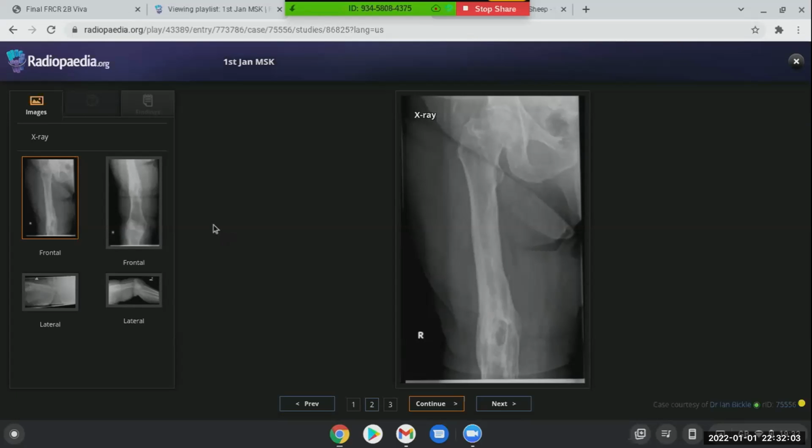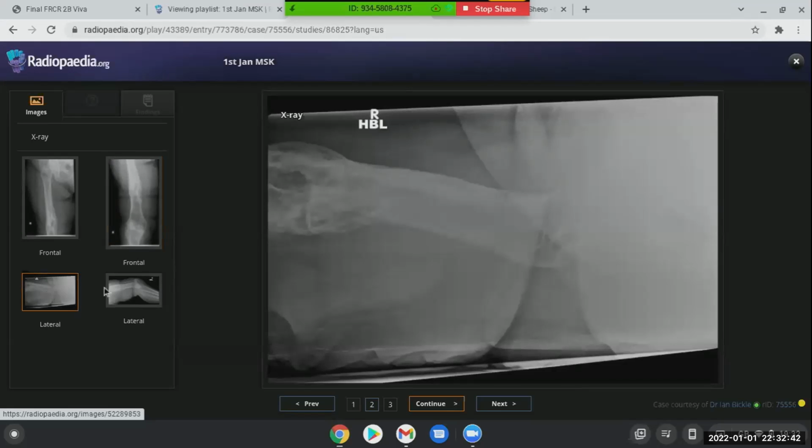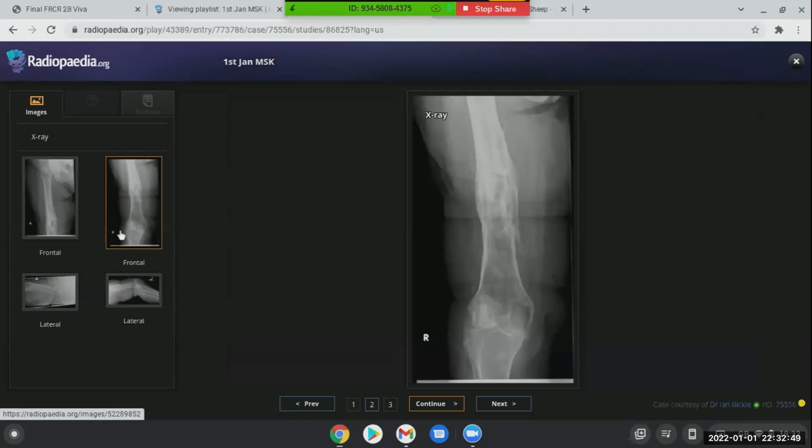So at the middle third or middle to distal third of the right femur, I can see altered modeling of the femur with ill-defined mixed lesion centered on the medullary cavity with central lucency and surrounding ill-defined sclerotic changes associated with the focal expansion of the bone and some cortical or endosteal thickening. However, I'm not sure if there is any cortical breaching or not. I'm not sure to judge about the cortical breaching or associated fracture in these views.